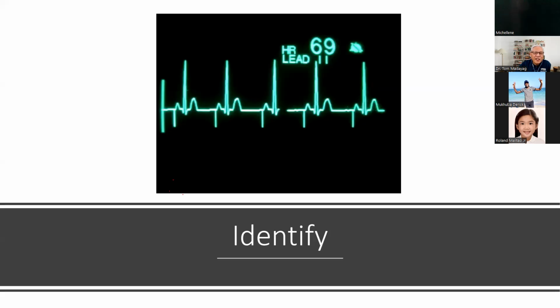All right. Let's discuss this particular ECG strip. And this is actually an ECG pattern that reflects the presence of an atrial pacemaker. So let's see, what are the characteristics of an atrial pace beat? Well, as you could see right over here where I'm pointing, you have again a pacing spike. And this pacing spike is followed by a P wave. And therefore, we know that this pacemaker is an atrial pacemaker.